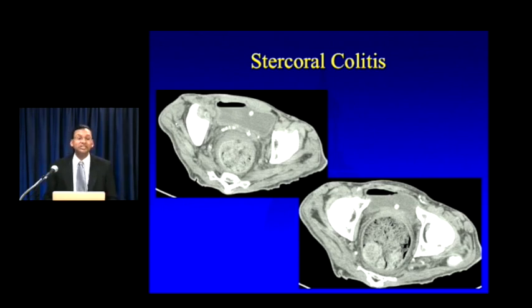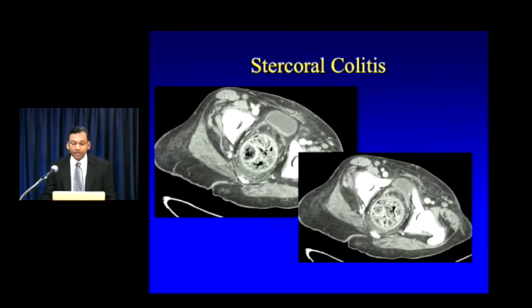Now, I know ER physicians may not like hearing that from a radiologist, but the truth is you really want to be very explicit to the physician that this does place the patient at risk for GI bleeding and perforation. Here's another example. Again, thickened rectum, subtle stranding, formed hard fecal material distending the rectum. You want to recommend disimpaction.